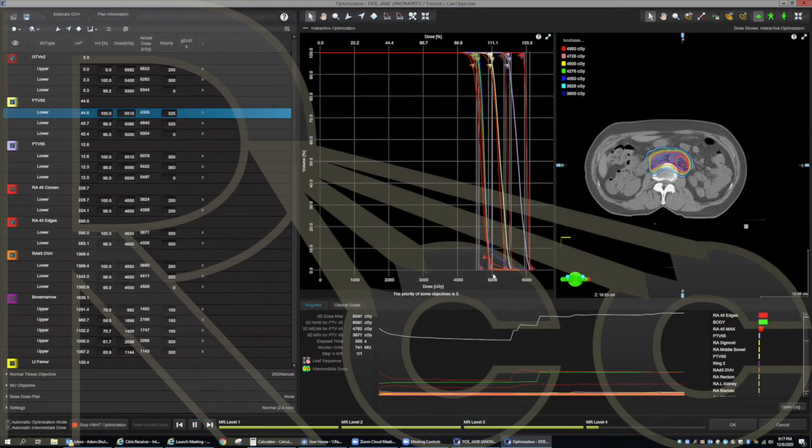Again, I could lower these maxes a little bit more if I spend another 10 minutes or so. I could lower each max and make all these shoulders a little sharper, these high doses a little lower. I could mess with this edges contour some more, but I think we're about where we need to be. So I'll just finish it off. And then we'll quickly look at the isodose lines on the plan. And then we'll end the call.